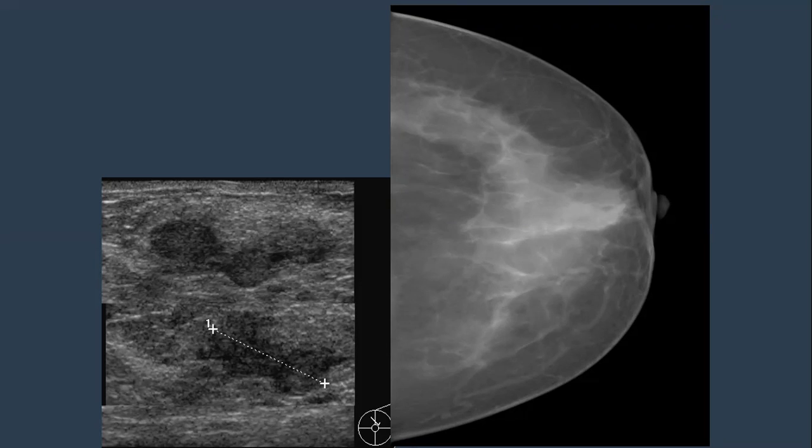So what do you expect? Just put in your mind the etiology. We described it before. Which etiology? What are the soft tissue masses within the duct? Either papilloma or intraductal carcinoma. Okay. So why is it associated with distortion? Invasion. It started to invade.